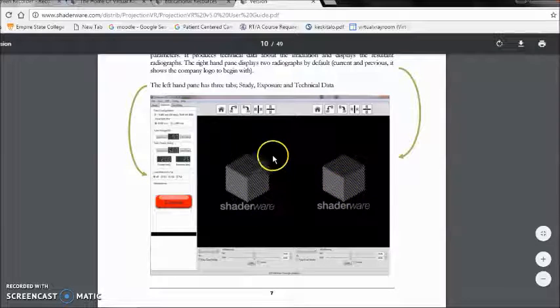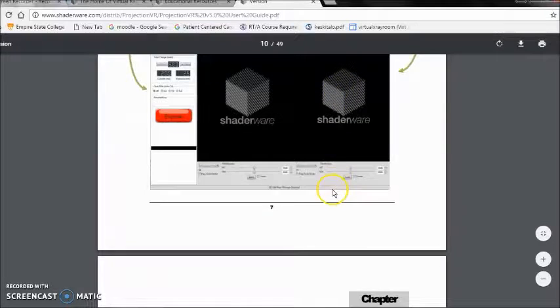So what we want to do is start to create an image that is very similar to the one that the radiologist needs to be diagnostic. If you look down here at the bottom, it also has window and leveling techniques here. You can manipulate the image to closely resemble what the radiologist actually wants. And towards the buttons up here, we also have the ability to rotate the image, to flip it, to mirror it, to flip it upside down on both sides.